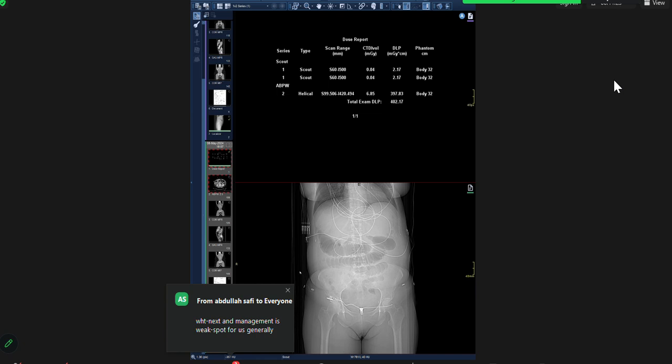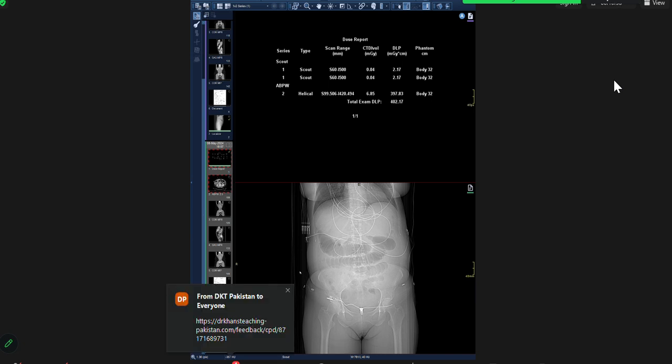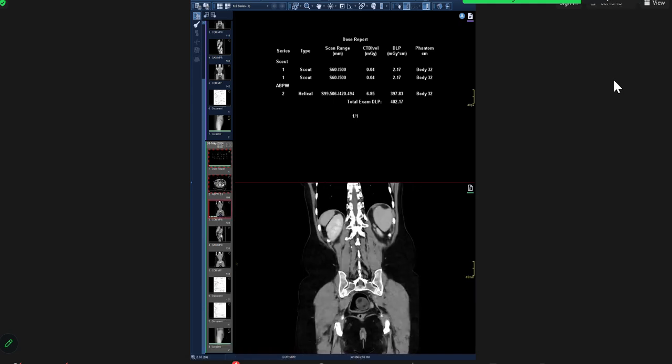And then for small bowel, you try to see where it is. Does the patient have an internal hernia? Number one. Is it mesenteric ischemia associated? Is there ischemia associated with this small bowel obstruction? Do you see the superior mesenteric artery and vein very well? Is there any problem in the appendix? Is there any inflammation in the abdomen? So these are the general points you would see. And then of course you want to see the lung window for that.